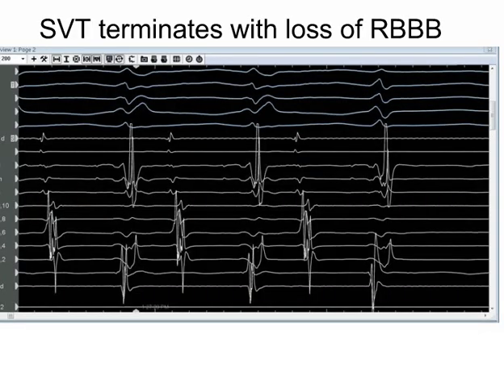Here's an interesting finding, and this wouldn't even probably cross your radar screen most of the time if you saw a tachycardia terminate like this. But what I want to make sure you always do when you're looking at board questions, number one, but also when you're looking at cases in the lab, is look at the surface first. So if you didn't look at the surface, you might not notice that the first two beats had right bundle branch block and the last one did not. So you look at the surface, you work your way down, you look at the V's, you look at the A's, are there hisses on the His catheter, and you want to try to account for everything, including the surface.